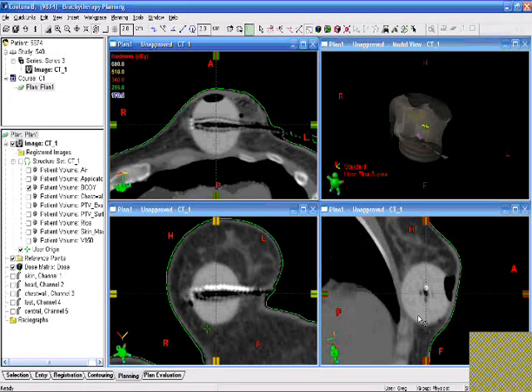And you see in this particular case, in the transverse view, we're seeing it from the opposite direction. So they're increasing counterclockwise. Keep that in mind. You can't always tell which way that's happening, so that's why it's useful to have markers in both of those. You can see in this case the marker under channel 1 is very well shown.